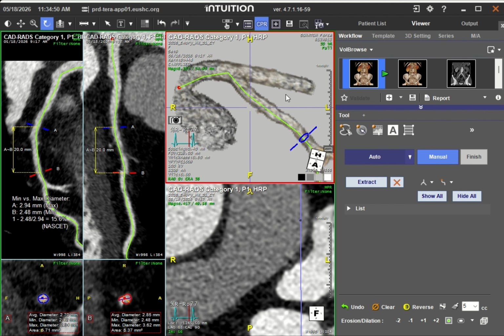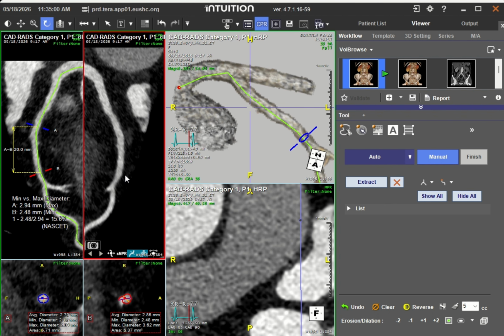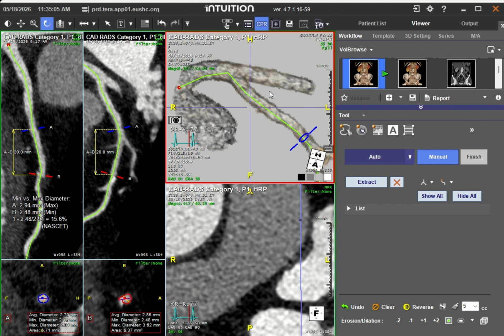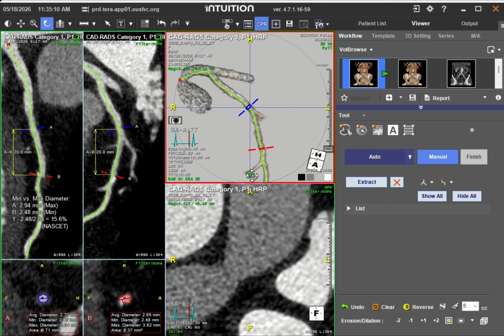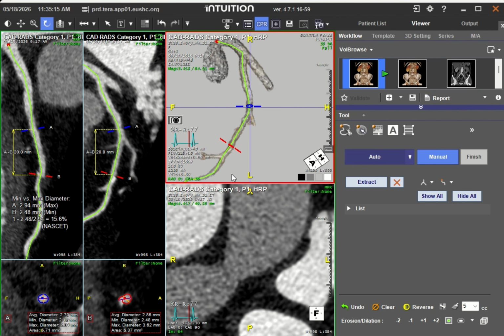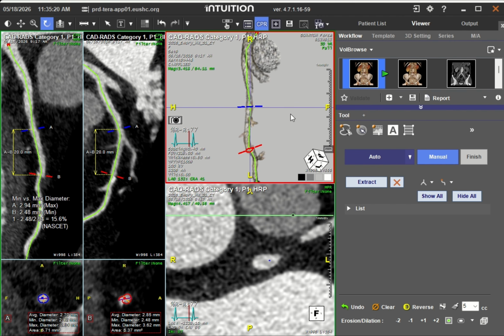Perhaps now is a good time to explain that there's really an infinite number of these CPRs. Most people think it's just you do it and then you have one CPR to rotate through. The reality is that since they're generated based on the orientation of the data in object space, if you orient the vessel from inferior to superior, you will get a different CPR, and where you center it, there'll be less artifacts.